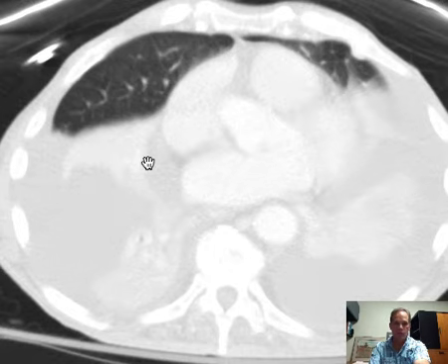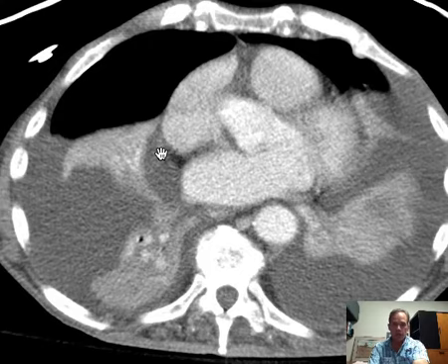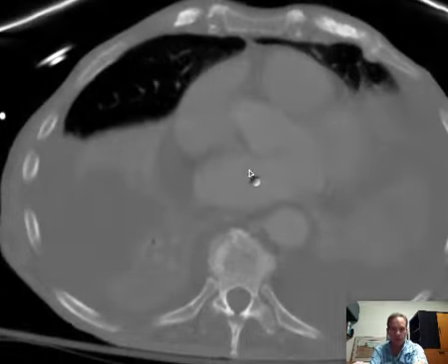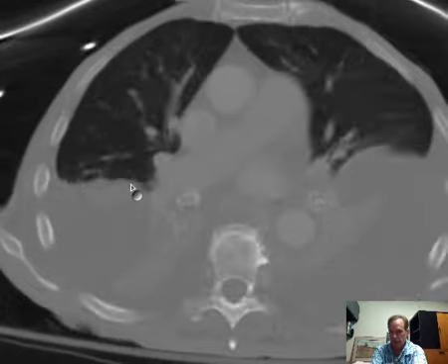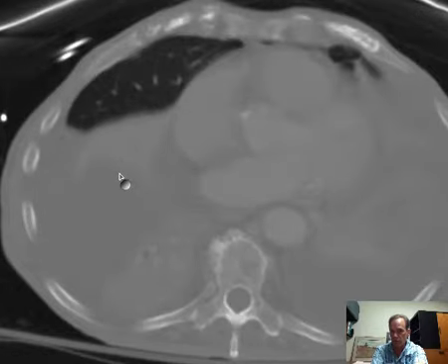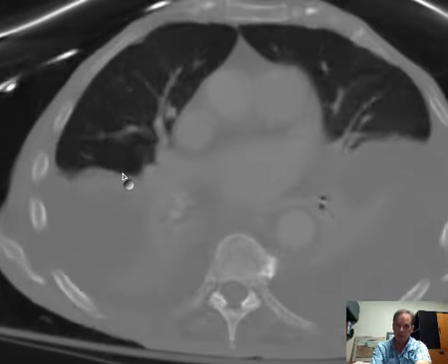Let's put it on the lung window, or partial in-between window maybe, and see if we can discern some of the anatomy. There we go. Okay, so now here we can kind of see lung and this soft tissue there. So if I go up, when you get to the level of the superior mediastinum, that lobe basically has diminished to a very small amount of lung at that more superior extent, which is what you'd expect in the right middle lobe.